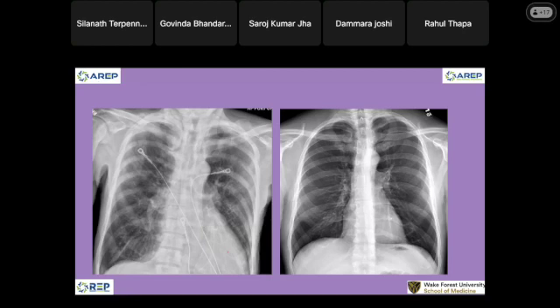Okay. What do we see? This person is really sick. The bone is not normal. This one is pretty eye-catching here, because the bone looks a little bit dense. It looks very dense here compared to the normal bone. We don't see on the whole thing, right, but this one looks dense, and the NG tube and ET tube look good.